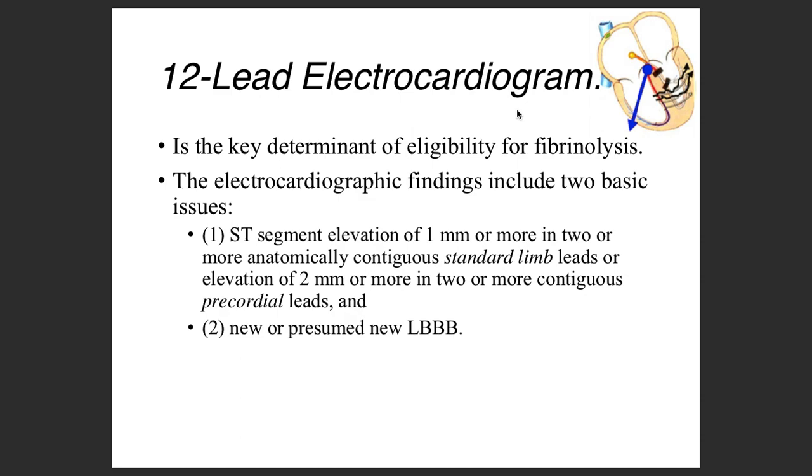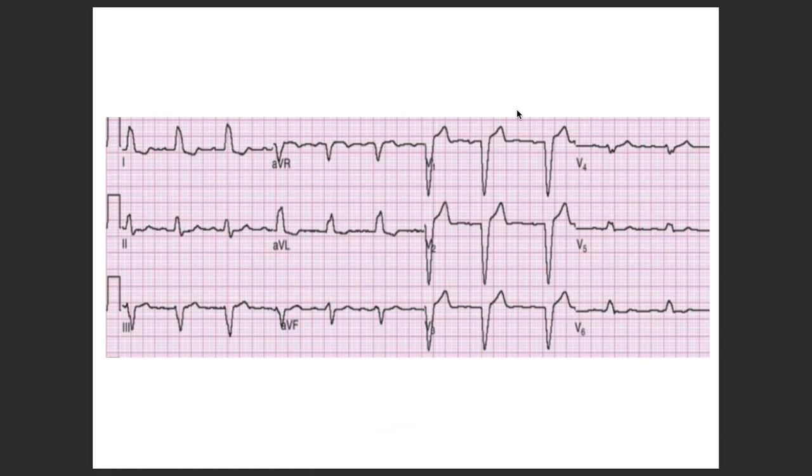Now comes the ECG. If you go to slide 5, can you see the ECG? The next one, yes. So this is the ECG with which the patient is there in front of you. So what do you think? What is happening to the lady? How do we report an ECG? What are the steps for that?